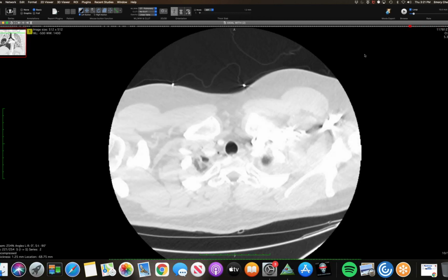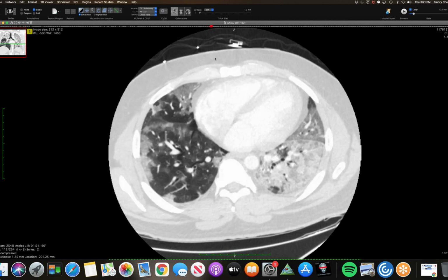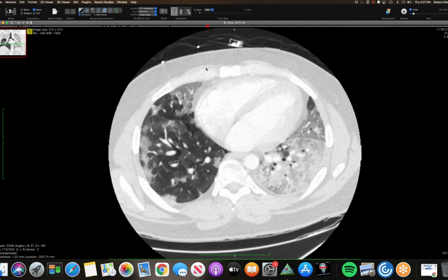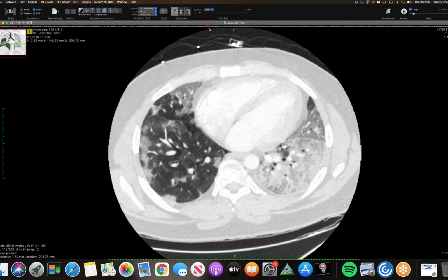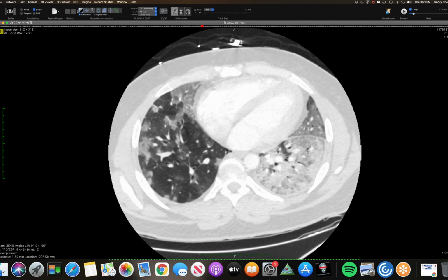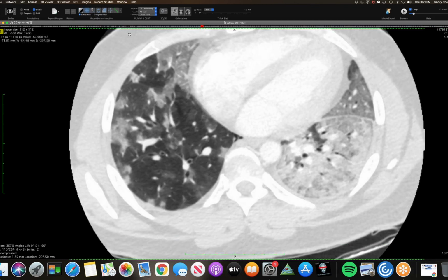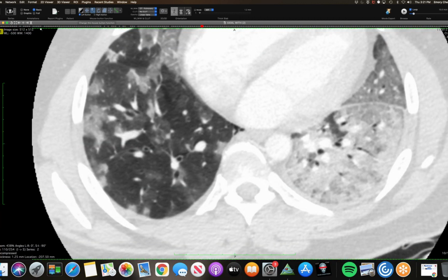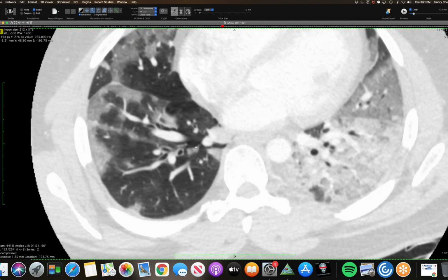He has air in his soft tissues, and if you look carefully as you go down, you can see these lightning bolt type of low densities here. So, a nice example of interstitial emphysema. Can you zoom that up? That's nice. In the medial basal segment. Yeah. So you can see it here.